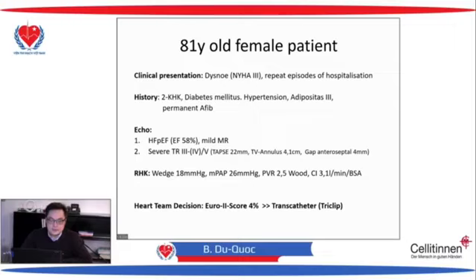And the echocardiography detects a preserved ejection fraction, 58% HFpEF, and a mild regurgitation of the mitral valve. And in tricuspid position, we have a severe to massive regurgitation with a normal right ventricle function, TAPSE 22. The annulus is mildly dilated, and the coaptation gap is about 4 millimeters.